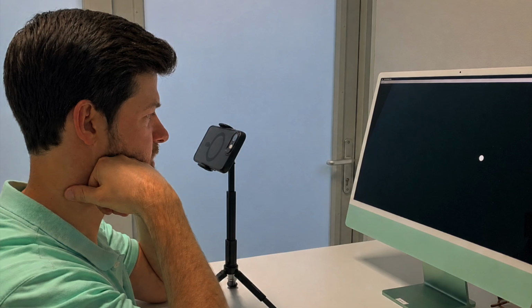Here we have a photo of the setup that I use in my office when I'm recording with EP Recorder. For the photo, the light on the phone was turned off, but otherwise this is how I would do it. The phone's on a tripod, maybe 5 to 10 centimeters from my face. This would be for 2-eye mode. For 1-eye mode, I'd get it in even closer.